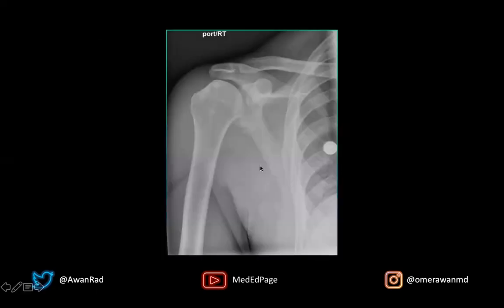If we take a look, the humeral head is articulating normally and well with the glenoid process of the scapula. However, there is a defect here along the lateral aspect of the humeral head, reminiscent of what a Hill-Sachs lesion would look like from a prior anterior glenohumeral joint dislocation. And also the inferior glenoid here looks a little ill-defined and irregular, suggesting there may have been trauma here and possibly a Bankart lesion or injury to the anterior inferior labrum and possibly the bone.